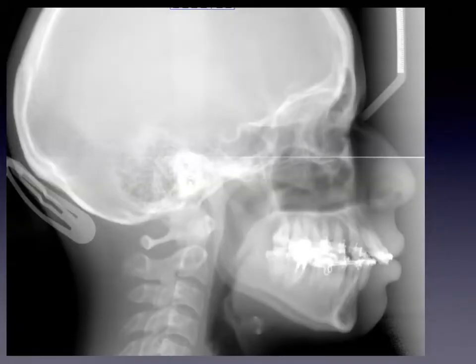So her 4 bicuspids were taken out and teeth retracted, but as they were retracted, and this is just 2D x-rays, but as they were retracted you can see that the lower incisor roots, crowns tipped back, the roots tipped forward, and they came right through the cortical plate. So now what do you do? So I wasn't attending, but the attending said, we better get those teeth tucked back into the bone.